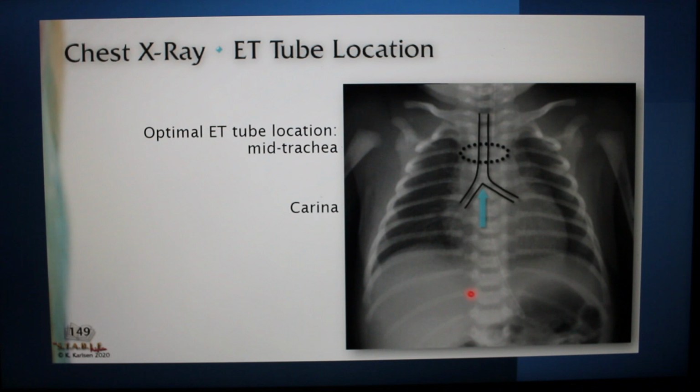The 11th and 12th ribs on a premature baby are frequently hard to find. They're smaller ribs. They don't go all the way around. These ribs start at the sternum and go all the way around the body and attach to the vertebral bodies in the back. But these ribs are called floating ribs, and they're only attached to the vertebral bodies.